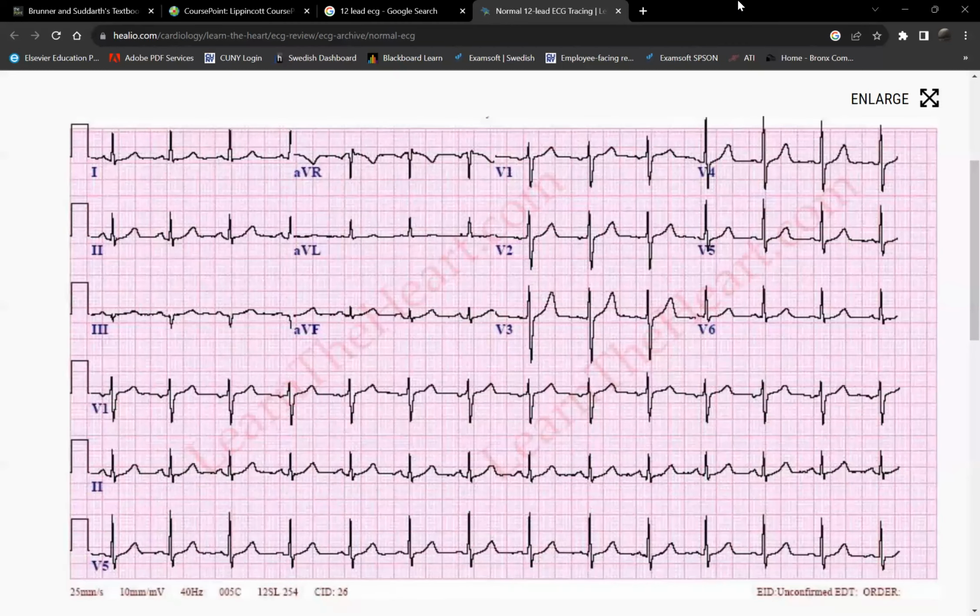And then you have the aVR, right arm. That's what it looks like as far as the right arm is concerned. Left arm resembles lead 2. Okay, it's similar. Then aVF, this is the left foot. There is no aVR foot on the right because obviously there's no lead on the right foot. You have V1 all the way to V6. Okay. Any question? So this is what you're looking at. So that's why it looks different, because they have a different vantage point.